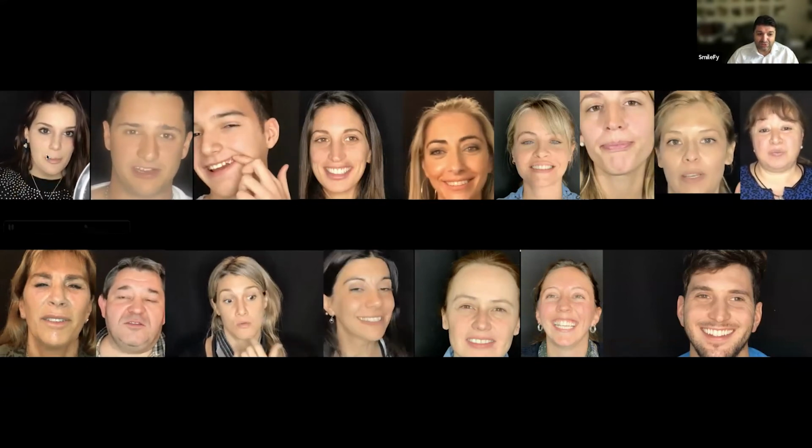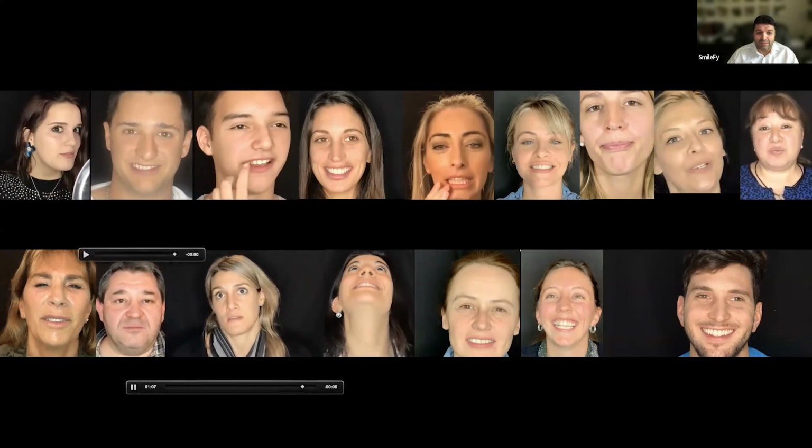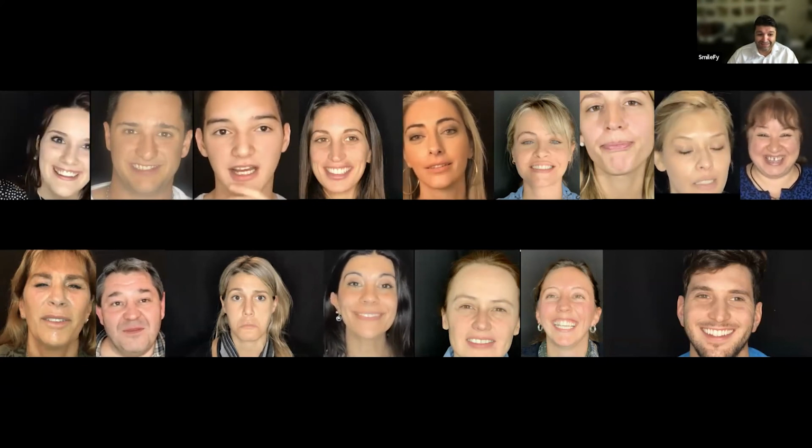To design the facially driven smile, because if you check on the left side, the bottom, the second gentleman, you see that in the rested position when he talks, his upper teeth are almost not visible. So when we design the smile, we're going to design a beautiful smile and he's not going to show anything, right, Adrian? Right.